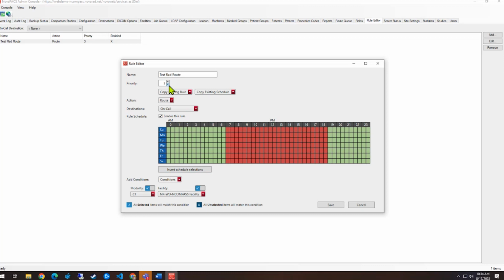We usually recommend it stays there. We sometimes run into issues in support where people like to make it a higher priority. But if you make it a priority 2 or a priority 1 here, it's one of those situations where if everything is urgent, nothing is urgent, and it will just queue with everything else. So if you leave it at a 3, everything in there is 3, something urgent comes up, then you can override that and make it a 1, and then it'll go faster.